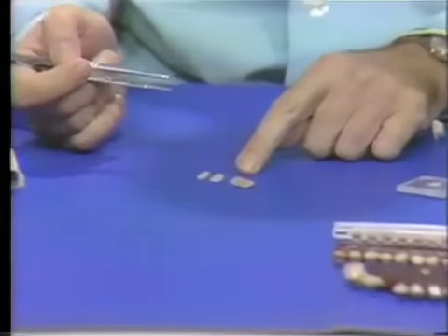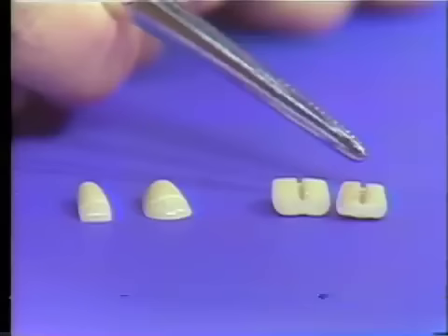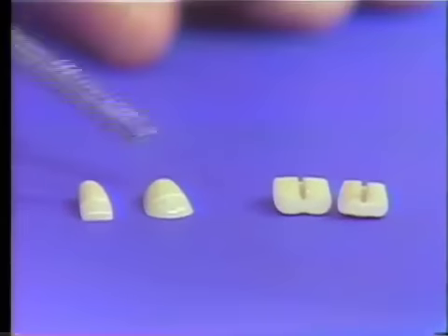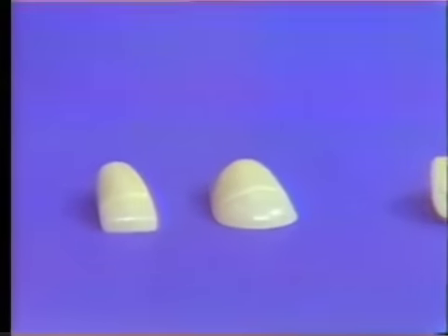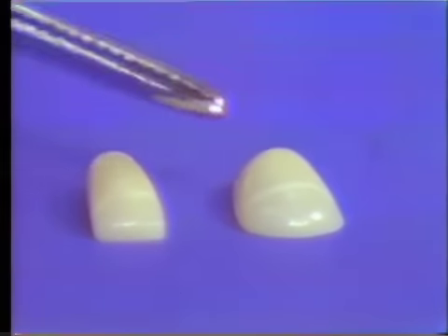These facings are made for all teeth. Here's a mandibular incisor, a maxillary cuspid, here's a maxillary molar, and a maxillary incisor. And you can see here on the fitting surface the central groove here that adapts to the backing. And these, of course, are the labial surfaces of this particular one. This one's got a mark across there, as you may notice. This is because they come from a mold guide. And all of the facings have been marked that way, so no one will be tempted to take them out and actually use them, and then you get deficiencies in the mold guide. So that is just an artifact cut across the facing there.